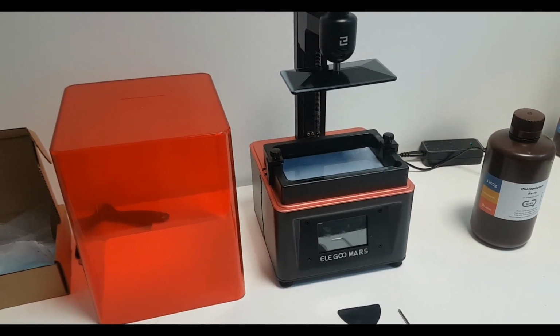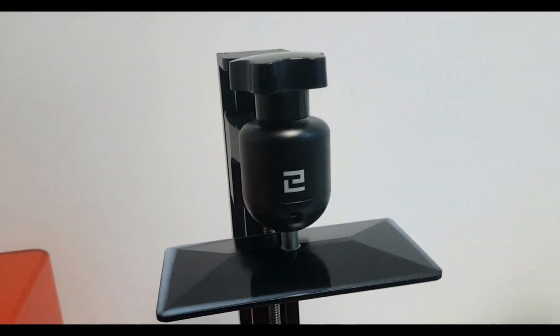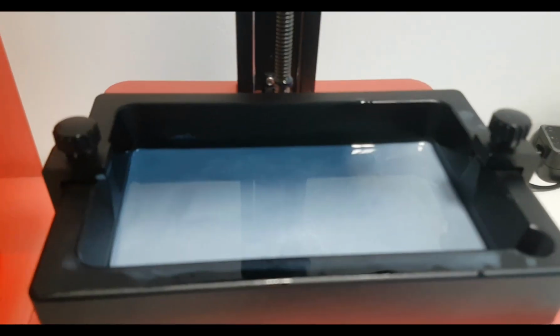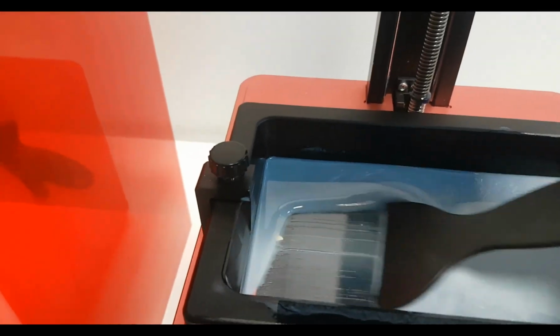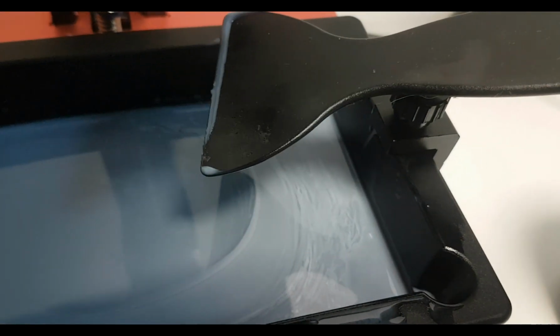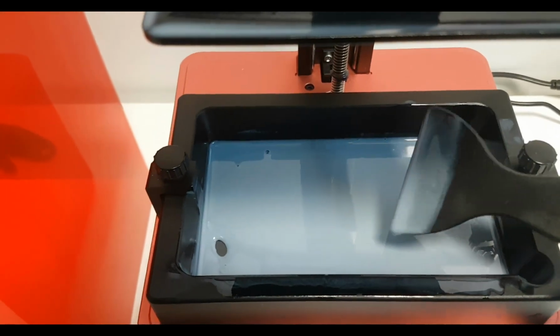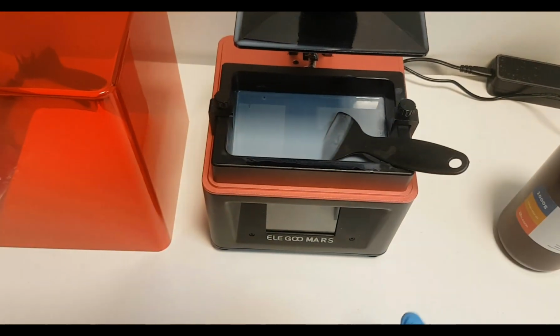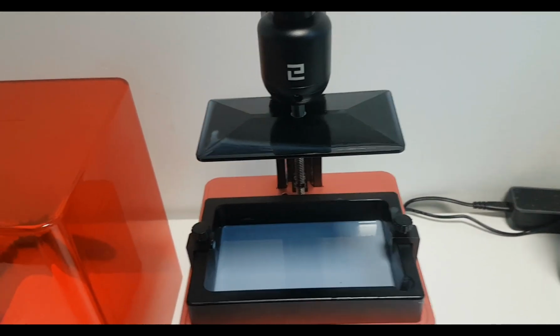We now move on to the 3D printing process. This is an inexpensive MSLA printer called Elegoo Mars, and we'll be using the resin of the same company. And this uses a cell phone screen to cure a photosensitive resin. The disadvantage of using a cheap machine and cheap resin like this is that the pigment can separate, so you have to mix it frequently to make sure there is no problem with the curing process. Also use gloves. This resin is very irritating, and you can have an allergic reaction if you're sensitive to it.